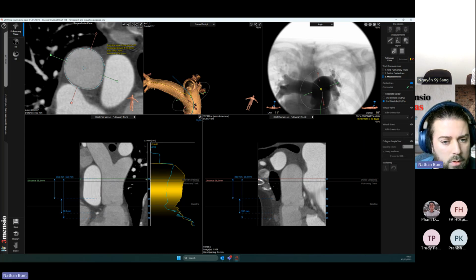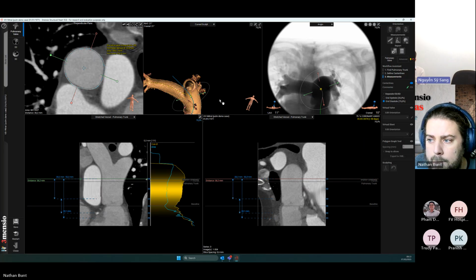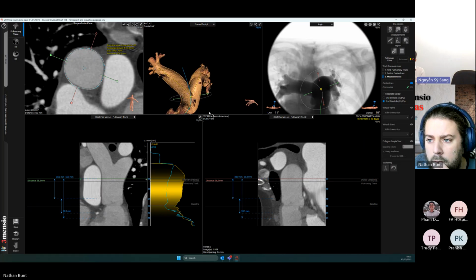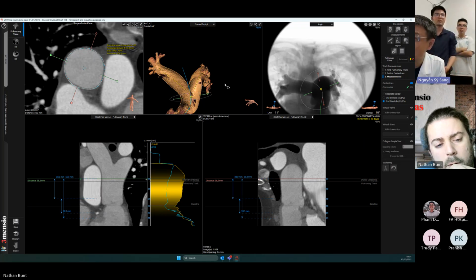Hello? Yeah. So this one, why on the CT image do you choose the place of the left artery, not the right artery? See the contrast is only in the aorta, not in the pulmonary artery. Sorry, could you repeat that question? Why do you choose the phase of the CT scan with the contrast in the left side, not in the right side?